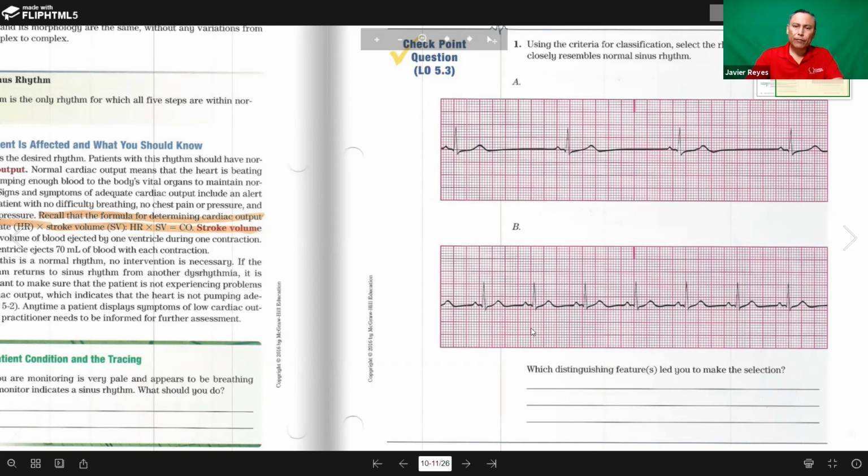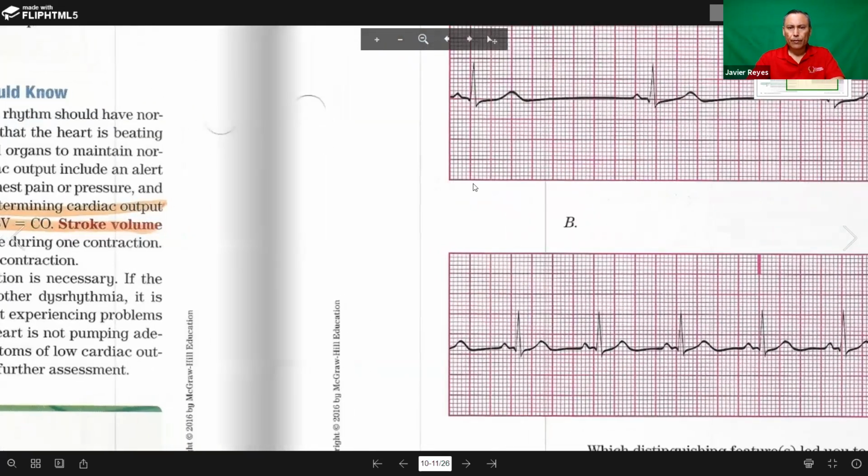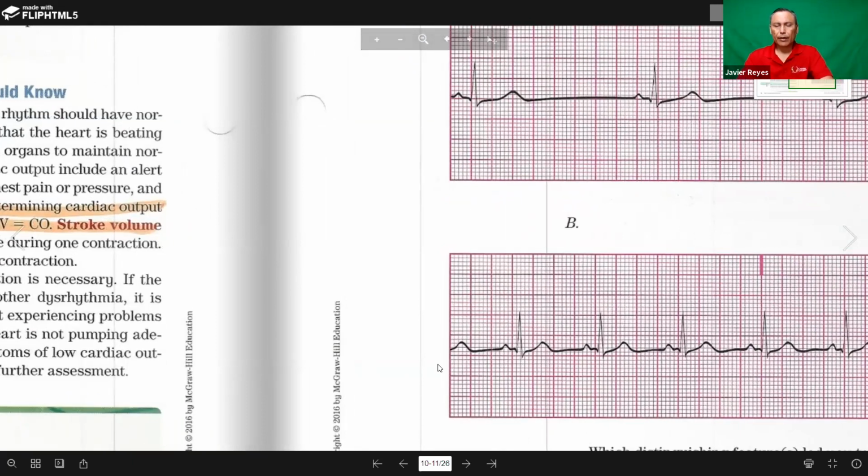And the last thing we have to evaluate is the QRS duration. How wide is the QRS? Can you all tell how wide this one is? That's pretty close. I think y'all can tell, right? How many little squares? I think it's 1 or 2. I can't really see. 1.5, right? Más o menos, 1.5. That's about 0.06. Up to 0.10 is the normal QRS duration.